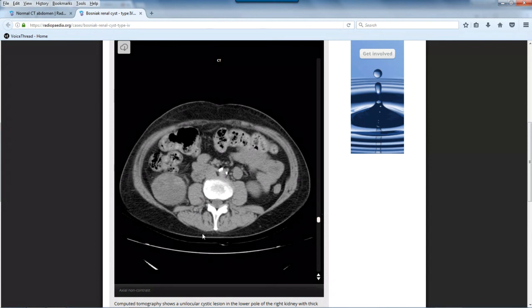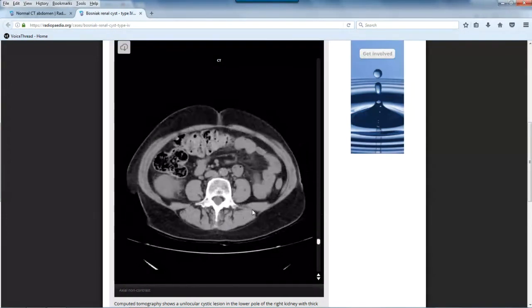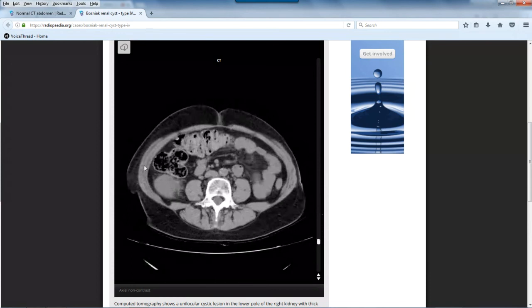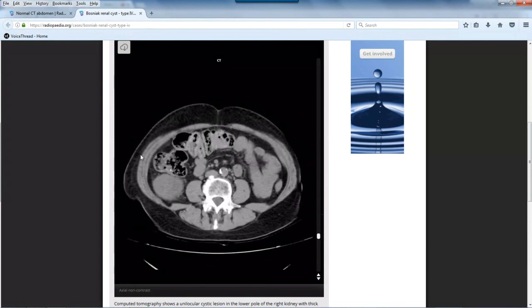You should be able to see all of these muscles. You should be able to identify them on an image on a test. The ones that I just mentioned, the quadratus lumborum, just posterior to the psoas muscles, you should be able to see psoas muscles, the erector spinae muscles, your sandwiched 3 muscles in here making up the lateral abdominal wall, external and internal obliques, your transversus abdominis, and your rectus abdominis, connected by this band of fibers, which is the linea alba.